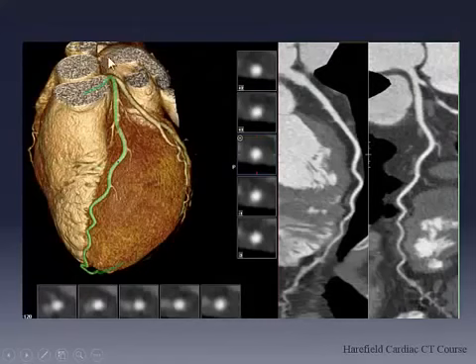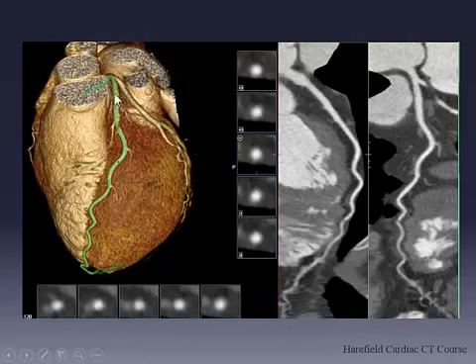Okay, so here, does everybody know what vessel this is? It's the anterior running on the left. So it's the LAD. So that is going to be a branch, probably obtuse marginal, I would guess, because the AV groove is back there. So this is still nevertheless a branch, isn't it? And here you're just picking out the LAD and you'll see how this works. But basically, volume rendered image, very nice for presentations and everything else, but not really of diagnostic value.